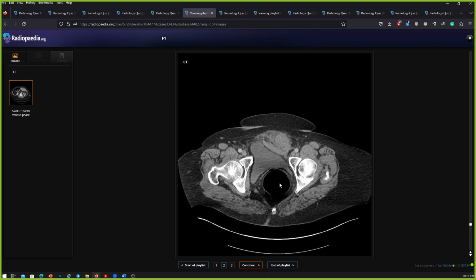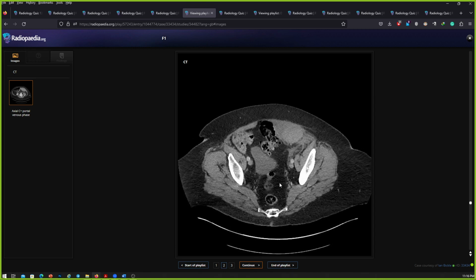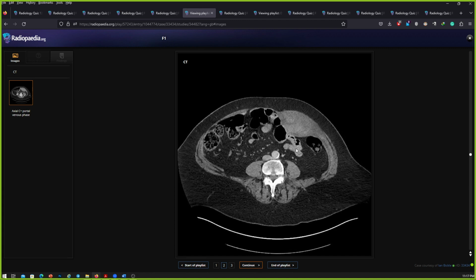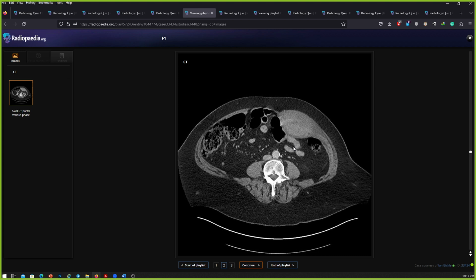Otherwise, it could be spontaneous hemorrhage due to a thrombolytic cause. There is diverticular disease and no other abnormality seen. So this is an urgent finding as there is active bleeding. I'll pick up the phone and alert the referring physician about the finding and correlate with the hemoglobin level and recommend referral for interventional radiology team for endovascular treatment.